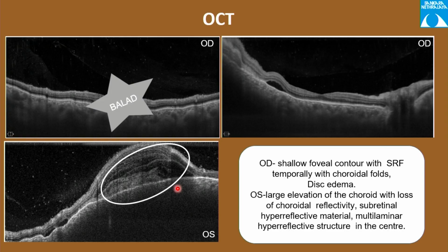In that, you may or may not have involvement of the vitreous, because in uveal lymphomas the vitreous may not get involved as a primary. But in PVRL, of course, it will start from the vitreous, and if you have not managed the vitreous well, that's when it goes into the sub-RPE infiltration.